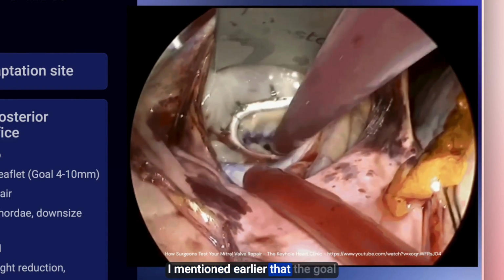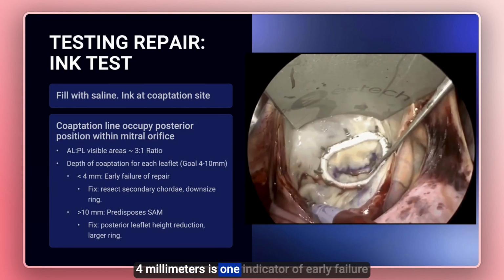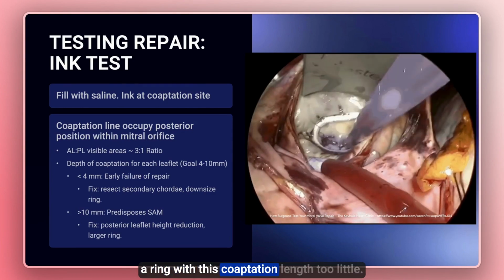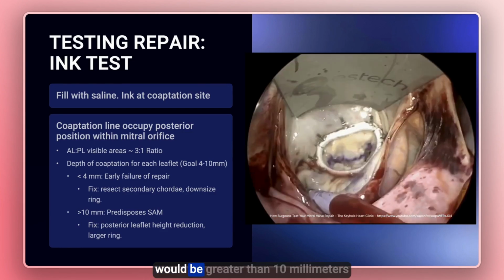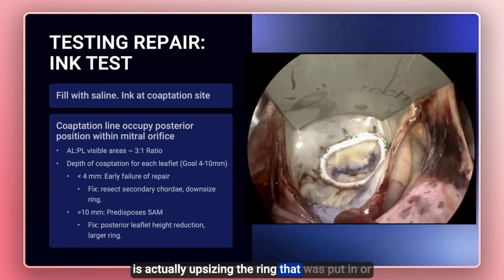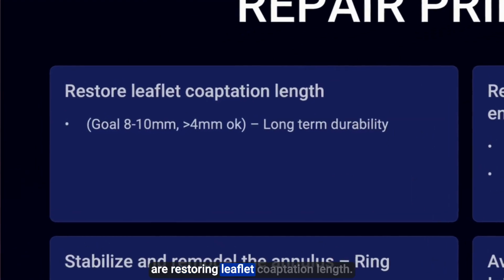I mentioned earlier that the goal coaptation length is 4 to 10 millimeters. This is because a coaptation length less than 4 millimeters is one indicator of early failure of the repair, and a surgeon may choose to resect secondary chordae or downsize a ring with this coaptation length too little. However, a coaptation length too much would be greater than 10 millimeters, and this predisposes patients to SAM. Something that may have to be performed here is actually upsizing the ring that was put in or performing posterior leaflet height reduction.